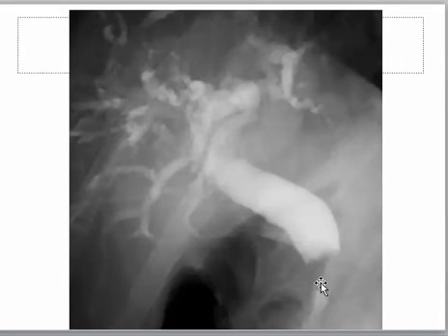Here is the typical cholangiocarcinoma, when we have obstruction of the common bile duct, dilatation of the common bile duct, and shouldering and irregular narrowing of the distal segment, marked dilatation of intrahepatic biliary radicals. So if you want to report this, you will say dilated intrahepatic biliary radicals, dilated common hepatic duct, dilated common bile duct proximal segment, and dilated cystic duct, and the rest of the common bile duct is obstructed. Cholangiocarcinoma.